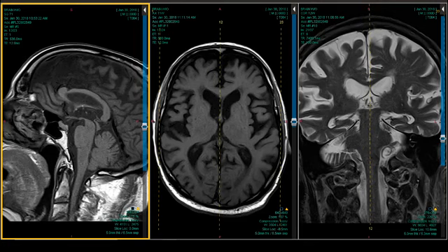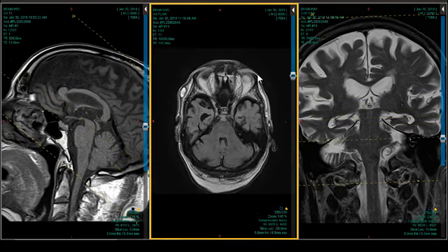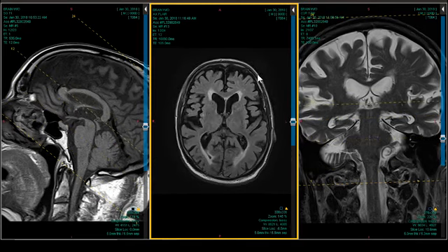That's not a specific finding. You can see mammillary body atrophy in Wernicke-Korsakoff syndrome. You've seen it in progressive supranuclear palsy, and you can see it in this disease, which is a disease of the limbic system. And let me keep looking and see if there is a thin slice to reconstruct.